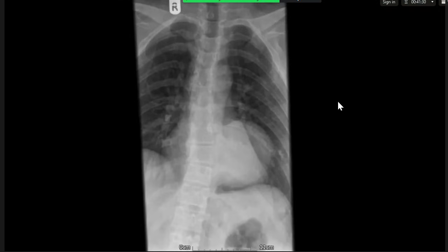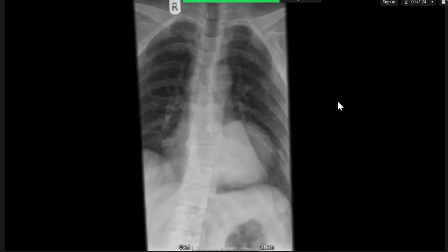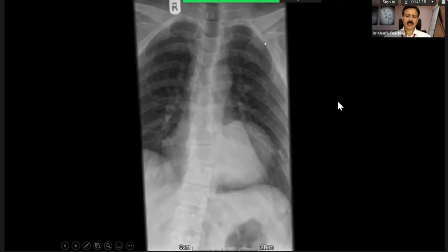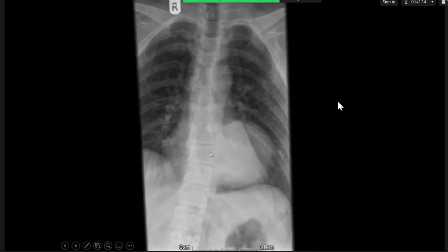So here, there should be a pedicle. Excuse me, I cannot see the mouse. Can you see my mouse? No. Oh, now we can. Go back, please. This is the area I'm looking at. So here's a pedicle, here's a pedicle, here's no pedicle. Excellent. Anything else?